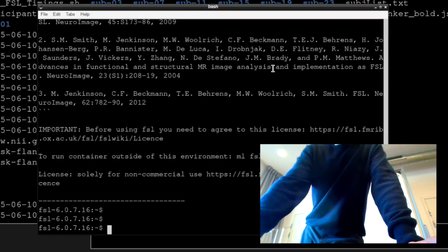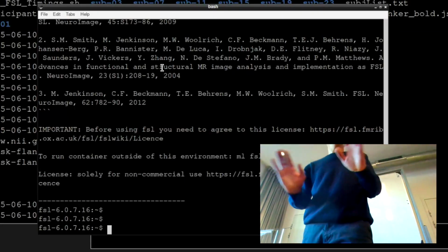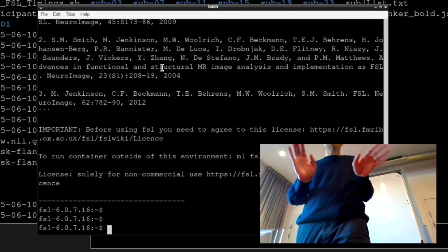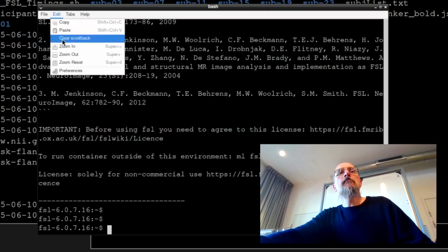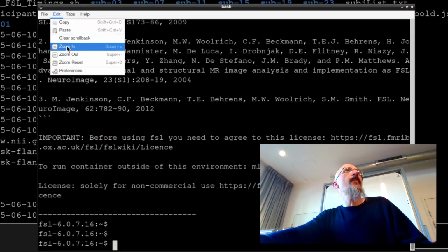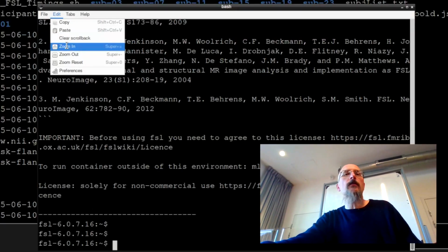Yes, as you wish. My desktop is always a mess because I always keep them open, so I cannot find anything after a while, but yeah, you can close it, as you wish. If you want to run parallel things, one subject, another subject, you can open two shells and do it in two shells differently.